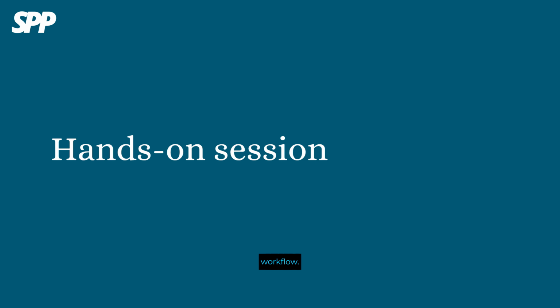We reviewed the overall workflow. Now, this is a hands-on session. We will go step by step. Please follow along and try each step yourself.